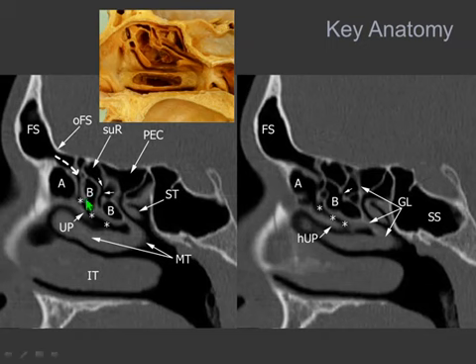The first one and the most anterior one is the path of the middle meatus, approximately located where you see the asterisk, and this path will drain the mucus coming from the frontal sinus, from the anterior ethmoid cells, and from the maxillary sinus. The key structure to separate the anterior from the posterior ethmoid sinus is the one you are seeing there. It is the middle turbinate.